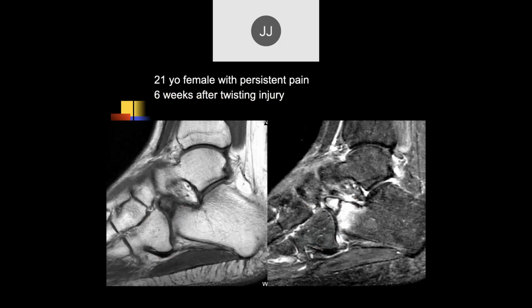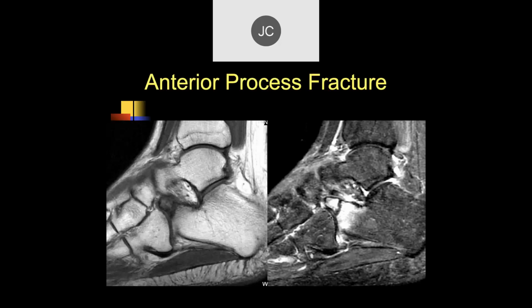All right, here we also have a fracture traversing the anterior process of the calcaneus with edema. Good.